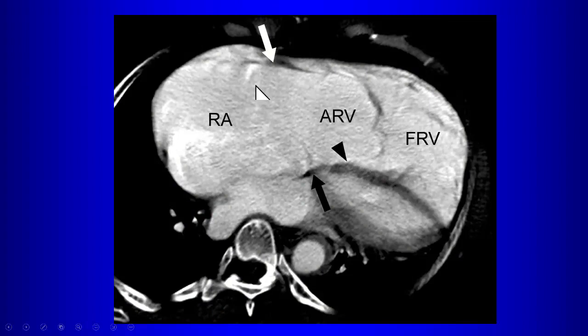the malformation results in obstruction of blood flow through the right heart. So the functional right ventricle here is actually quite small. ARV, that stands for? Atrialized right ventricle. This part should be the right ventricle, but it functions physiologically like the atrium because the tricuspid valve is displaced. So that's called the atrialized portion of the right ventricle.